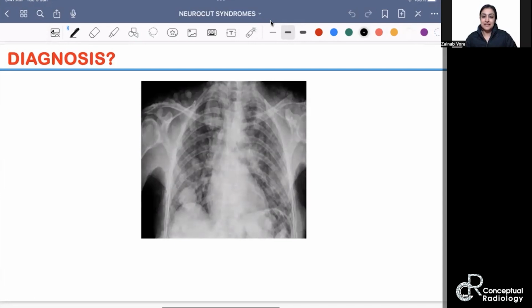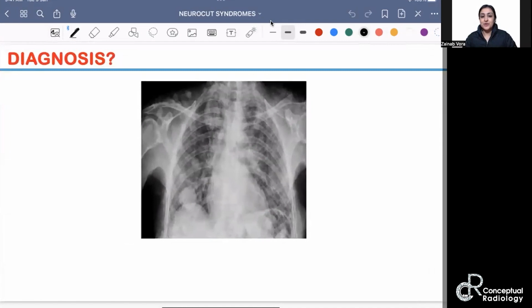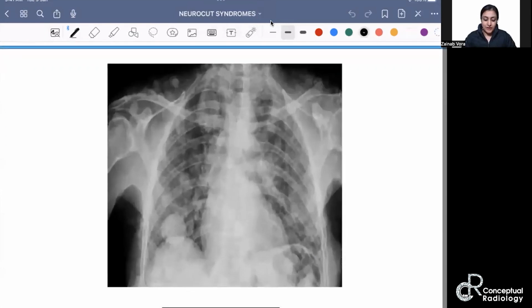So something like this, this is one of the most commonly placed spotters in a lot of exams, because at first instinct you think that there are multifocal nodules in the chest of the patient, and you mark it as multiple lung metastasis, or you call them cannonball metastasis, right? So this is what you have to be aware of, that it's not only the lungs, right?